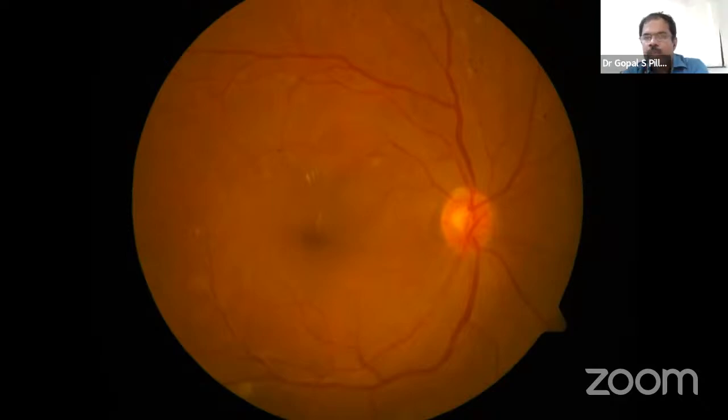Yash, where would the microaneurysm start? Is that a complete diagnosis? What would you like to complete your diagnosis with? Right eye. Sir, for grading of diabetic retinopathy, I would like to have more pictures. With this picture, what is it that you would say?